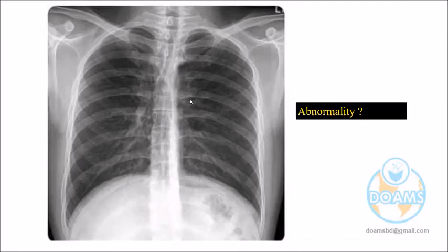There is no heart. Is it possible without heart a person can have his or her life? Where is it gone? Actually, it is some artificially, digitally constructed X-ray. So heart is not here, just to check your attention. Okay, heart was there, but heart is removed by digital technical characteristics. So where is heart? Heart not there.